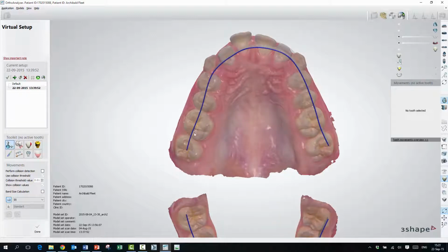And if I now want to move the teeth to this created arch, I can just simply have this as a guide to move my teeth in to the arch as a speed guide. Okay. Just to know. That's pretty neat. Yeah. All right. To move them in here. Okay.